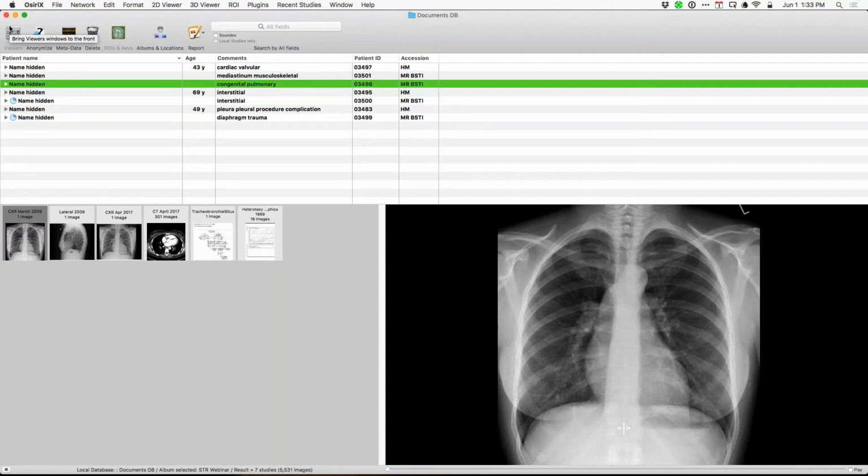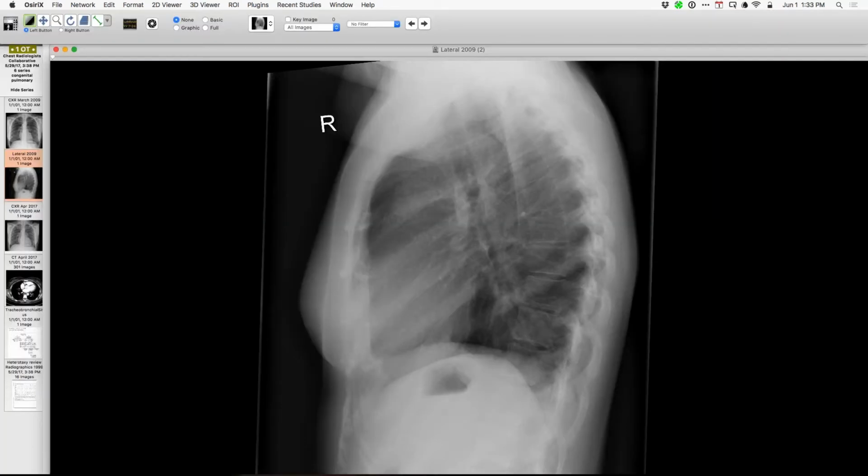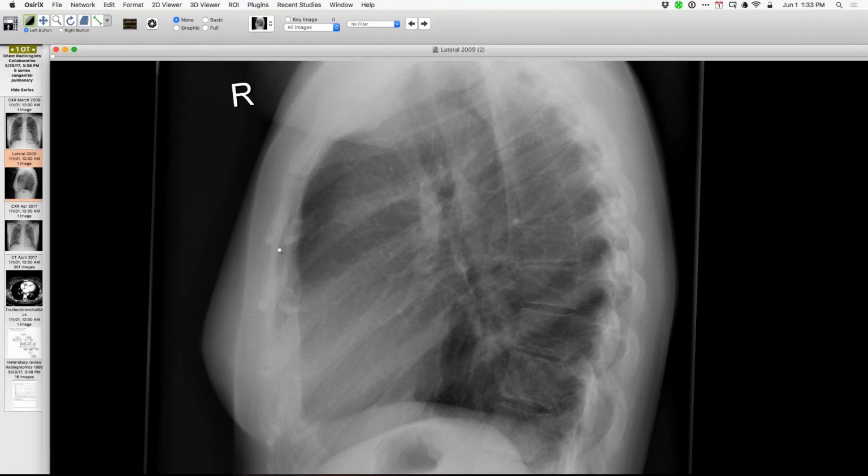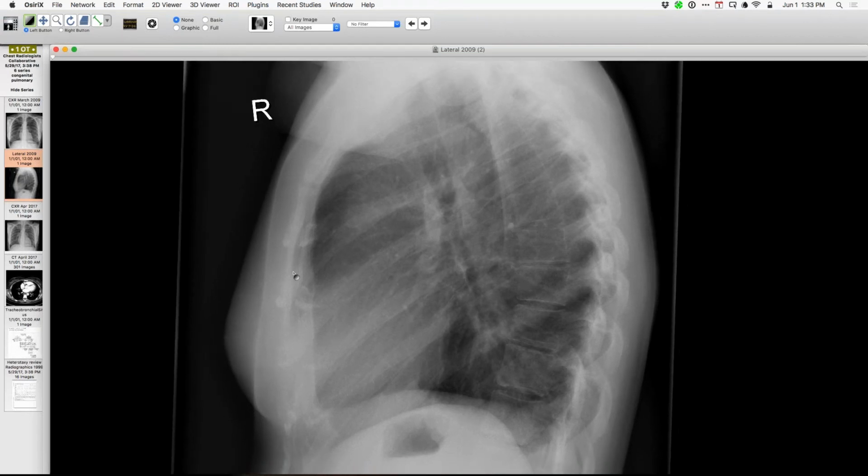So also staying with the lateral view here, there was an argument in the old literature about the absence of the posterior wall of the inferior vena cava plugging into the right atrium at the bottom near the diaphragm.